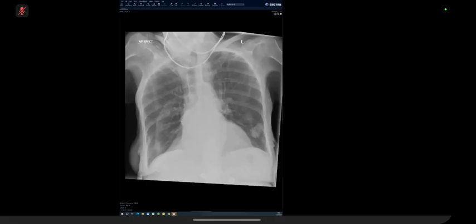Sorry, I'm just having a look through my review areas. So I'm looking at the APCs. I think it's a rotated film, so the APCs are within limits. There's increased density within the mediastinum itself, centrally. So I think, could this be a paravertebral mass? Okay. Anything else other than the increased density?